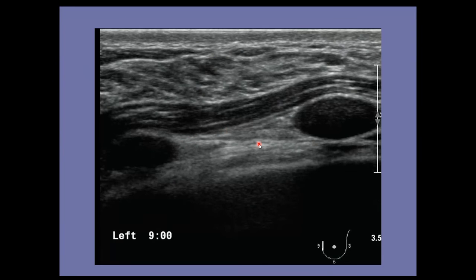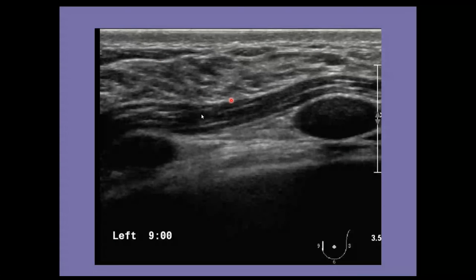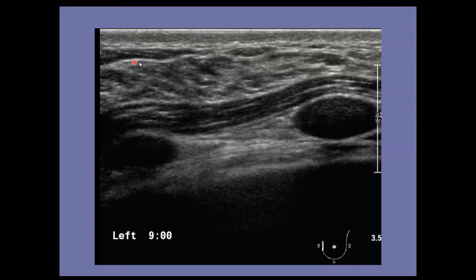This is the ultrasound of the breast. These are not cysts, not masses. These are ribs. Above the ribs, this is the pectoralis major muscle, and this heterogeneous tissue has some areas that are hypoechoic, some are hyperechoic: fibroglandular tissue, fatty tissue. This is the breast tissue, and behind the breast tissue there is this hypoechoic area with linear lines. This is the pectoralis major muscle, and this is the skin of the breast.